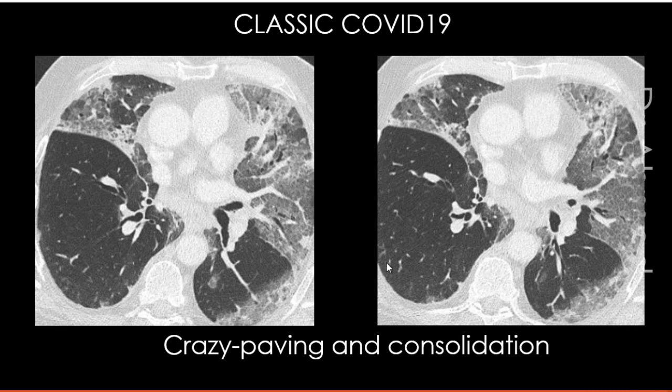Ground glass is an opacity which makes haziness, replacing the normal blackness of the lung, but not totally obscuring the underlying bronchovascular markings. With ground glass opacity, it is whiteness, but we can see the bronchovascular markings present behind it, like glass which allows us to see what is behind it. But consolidation totally obscures the underlying bronchovascular markings in the background.